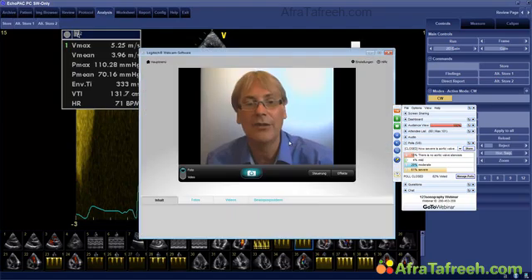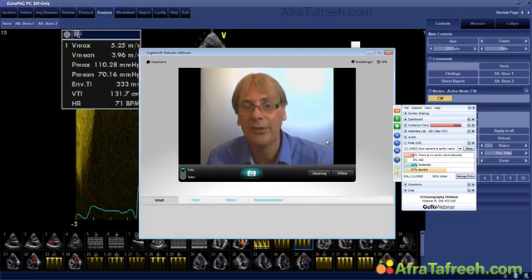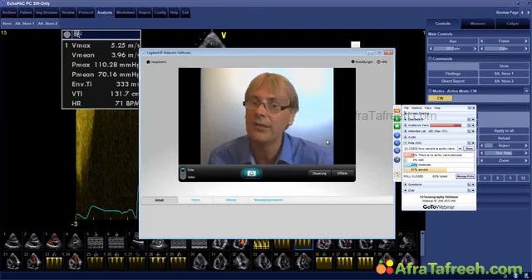Okay, so a fairly complex case, which obviously you might have difficulties to interpret, but which does show you very important things that are valid for every patient with aortic stenosis. Look at the spectrum, look at the subvalvular apparatus, and especially look at the valve. If you see an aortic valve which is not stenotic, which is not calcified, then it probably is not aortic stenosis, unless you have a bicuspid valve, because bicuspid valves can also be not calcified but very highly stenotic.